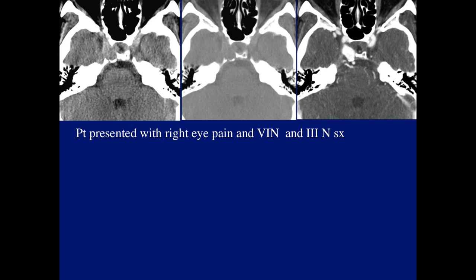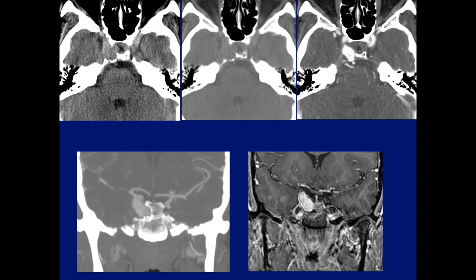Any diagnoses now? Nate has mentioned the right diagnosis. Nate and Gino. Aneurysm. Correct. You can see on the post-contrast this large structure here. More images are needed or will be welcomed. So here's the lesion. What about the CTA and MRA? What possible aneurysm is that? Originating from what vessel?